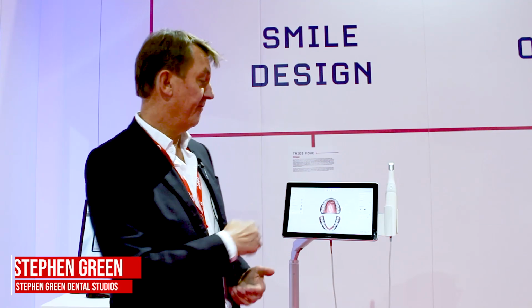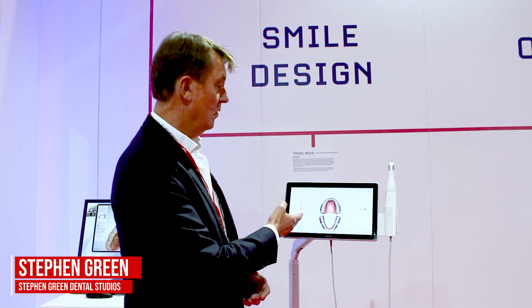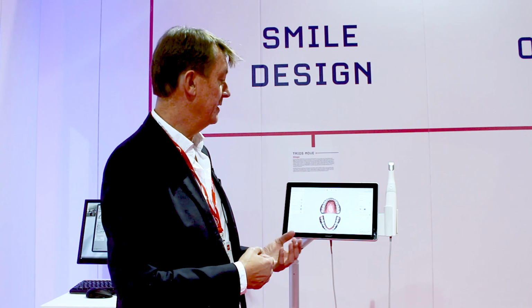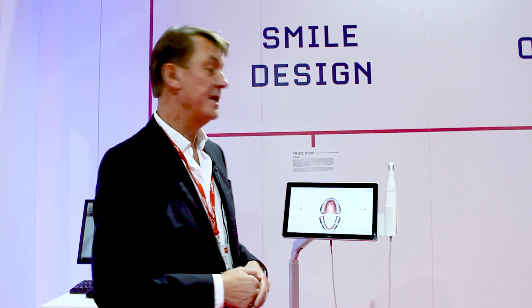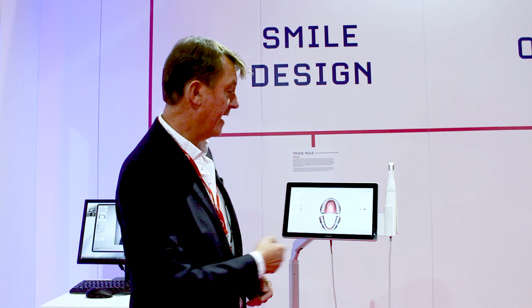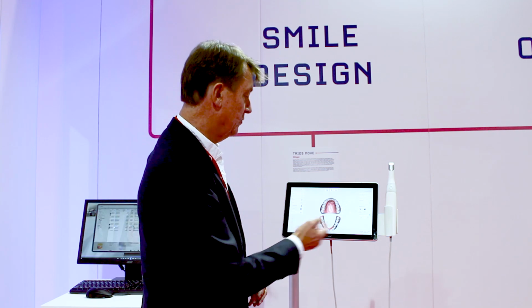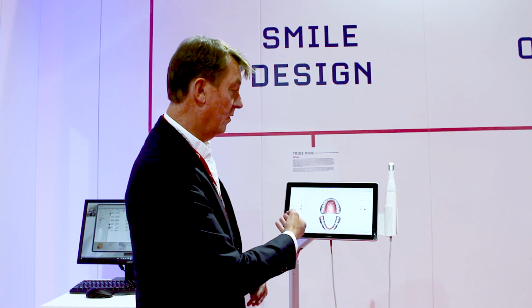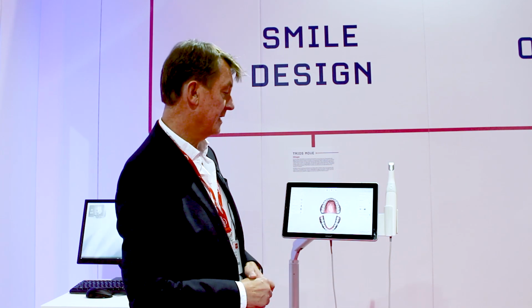So what we have here is the 3Shape move. With it, we have an opportunity to show the patient the possibilities of smile design. So what we have is we have the scan, we have the patient photographs, and we fill in the patient order form. Move on to the next stage.